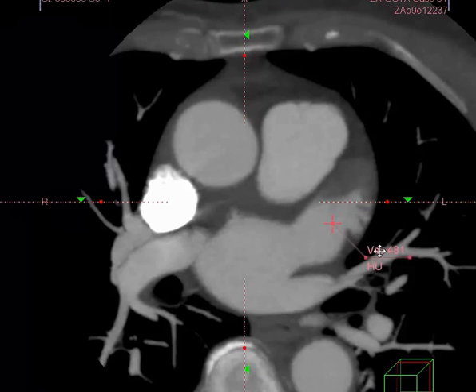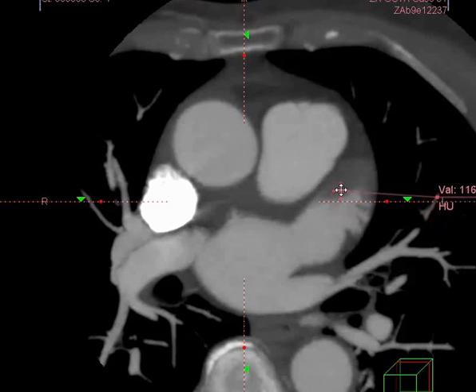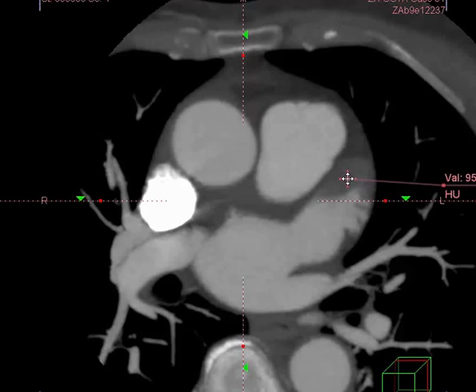If we look at the region of the left atrial appendage, we have excellent opacification, but if we proceed to the area that also appears to have some reduced density, we're getting densities of 100, 134, 97. These are higher than tissue densities, so that means that there is partial filling of this area. Now, part of the problem is separating thrombus from pseudothrombus, which means that we haven't imaged late enough in the cycle to see good enough flow into the upper parts of the left atrial appendage.